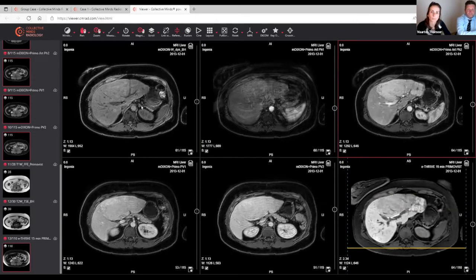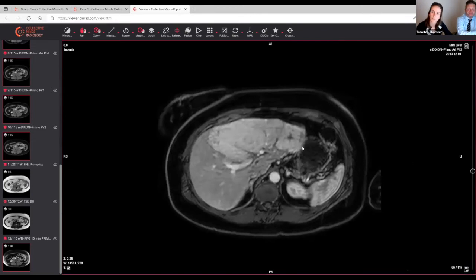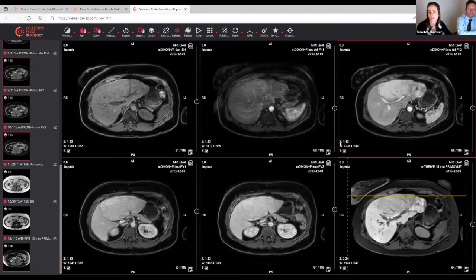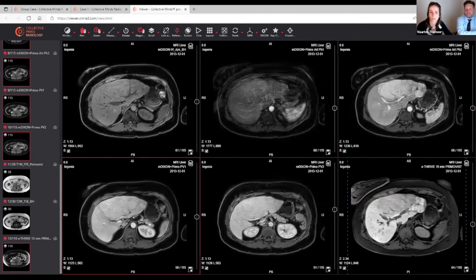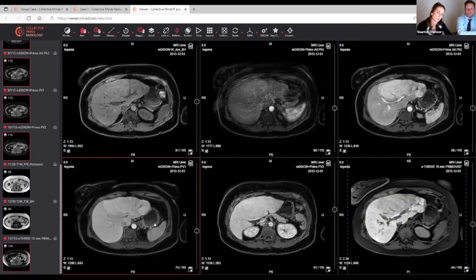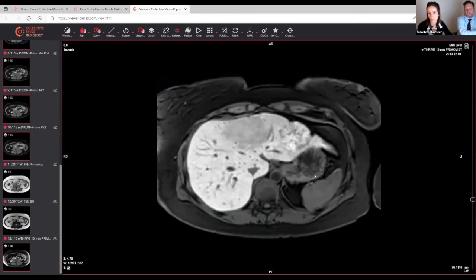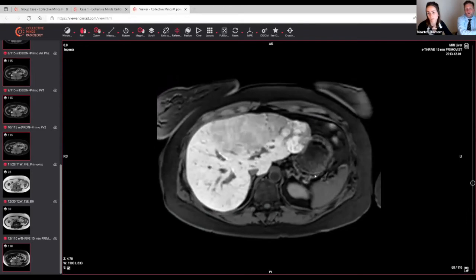Yes, totally right. And then in the arterial phase, it's again a hypervascular lesion, but there are some areas that do not enhance. Sharp areas of scar, yes. So in the center, but also maybe here. Yes. So should you worry about that region? How is it in the hepatobiliary phase on the right lower lobe? Can you enlarge it? So this is quite the same image. Why is it not enhancing? Why is there no uptake, do you think, in that region? I think it's also scar tissue.